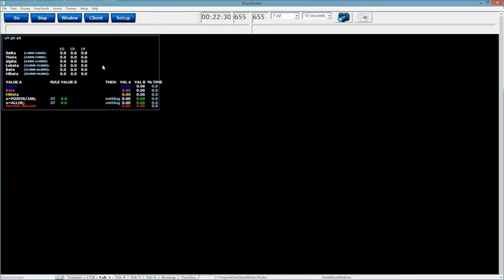Tech stats are just that. It's going to give you the tech stat information for all filtered wavebands. It's also going to get you all tech stats for any events that are active. So it is a very powerful tool, but as a big giant box like this, it is not usually utilized.